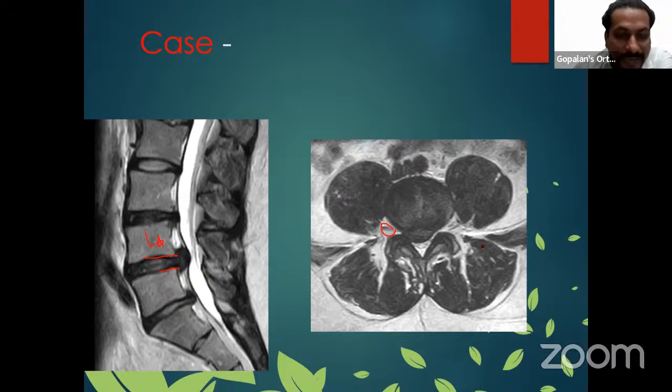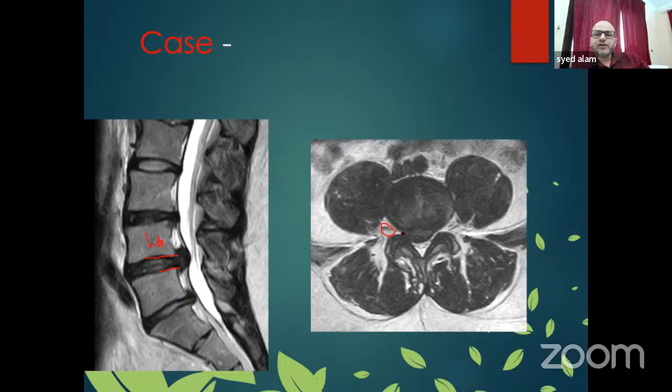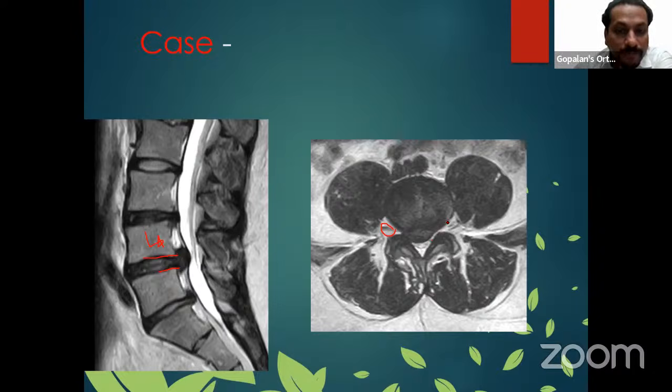Syed, can you mark out the extruded disc on the axial image? Okay. Very good. Excellent. Because axial is what people find very difficult to interpret. So basically, these all are extruded disc.